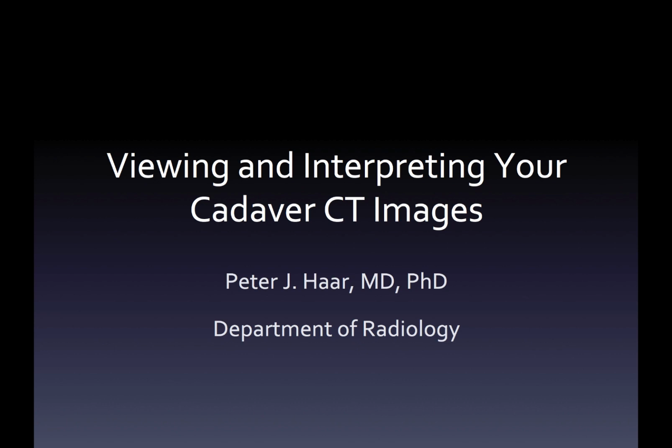I'd like to make this video now to show you a couple things. First, I want to show you how you can log on to access your CT images. Then I want to talk a little bit about CT imaging just to get you oriented, and I want to show you this web-based software we're going to be using to interact with your images and show you some of the techniques you can use to get the most out of your images.